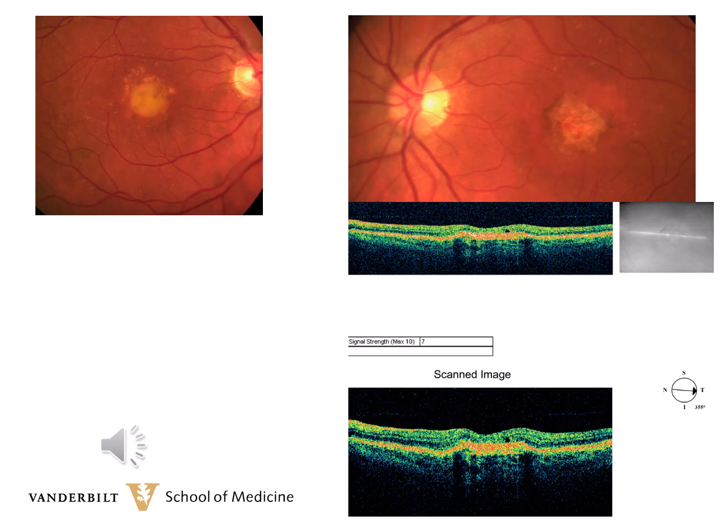She was started on monthly anti-VEGF injections in the left eye. The right eye remains stable at 20/50, and the left eye has regained the vision back to baseline at 20/50. Clinically, you can see that the fluid has dried up, and you can see the pigment mottling much easier this year than you could last year. The OCT also shows that the intraretinal fluid has fairly well absorbed.